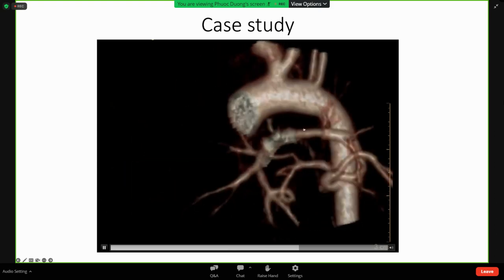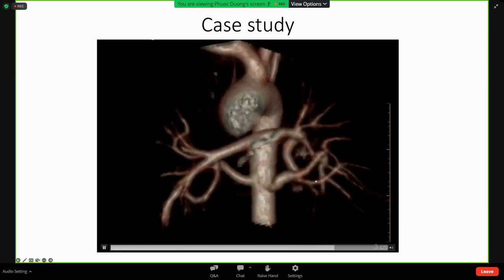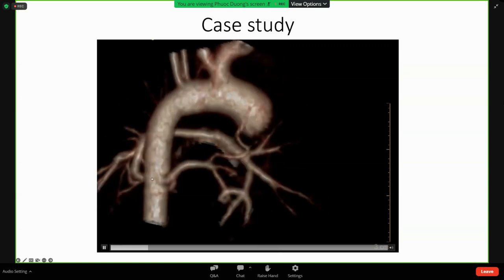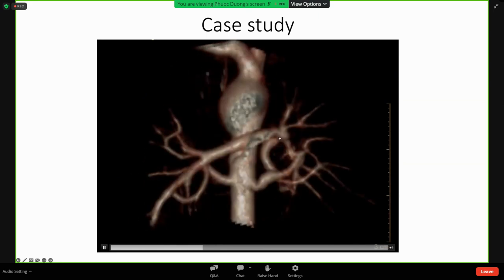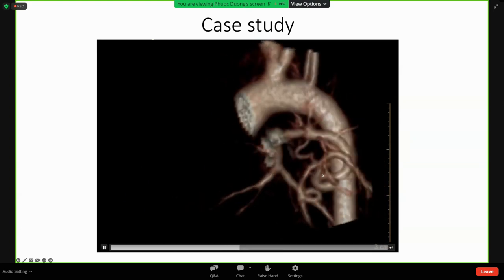When we did the CT before we planned the procedure, this shows that there's no native branch from the main pulmonary artery stump. The whole branches are supplied by all these MAPCAs here, predominantly one from the left side of the patient here supplying the left pulmonary artery towards the right pulmonary artery, and so on. And there are additional MAPCAs here.